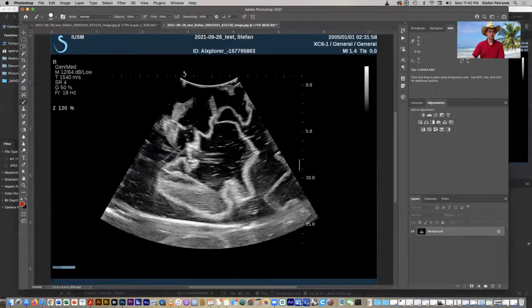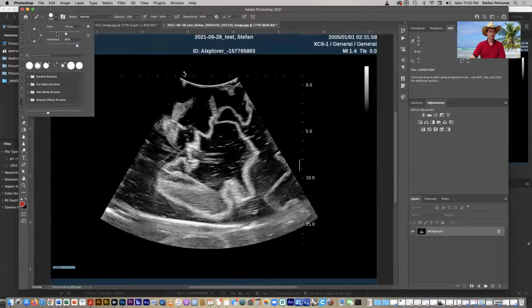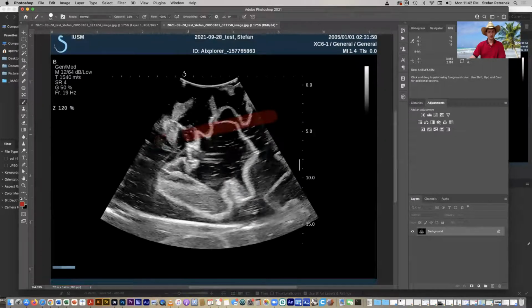Now, probably not that creative unless you're really good with your drawing skills, but you can adjust anytime. There are a lot of tools over here on the left-hand side, and I selected the brush. You'll get a menu up here, so you can change, say, the opacity of the brush down to, say, 30%. You can also change the size of the brush up here, some other types of brush shapes and all of that.